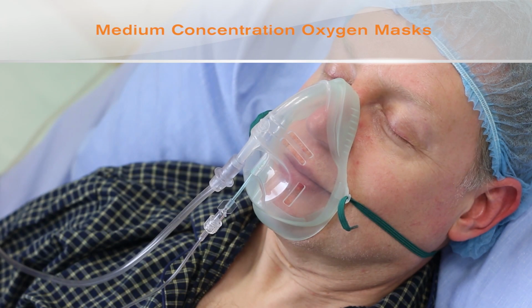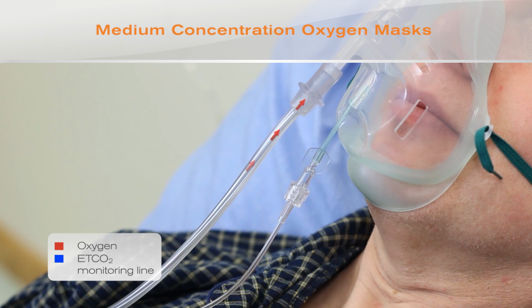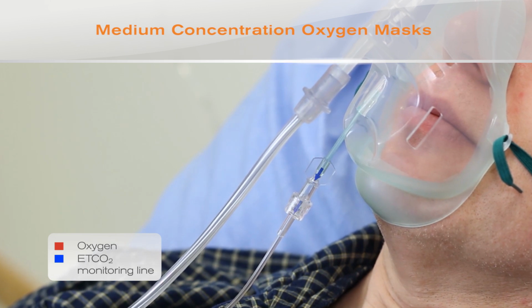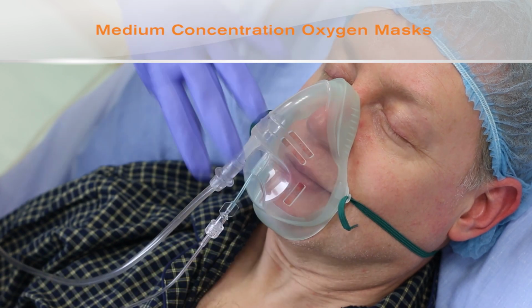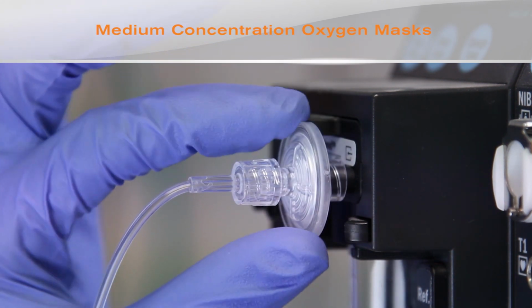Medium concentration masks, such as the Intersurgical Sentry mask, are also available, which feature the ability to measure end-tidal CO2. This is beneficial for patients undergoing conscious sedation, where respiratory depression should be monitored. A monitoring line can be attached to the mask with a Luer lock connector, and the other end is attached to a capnograph.